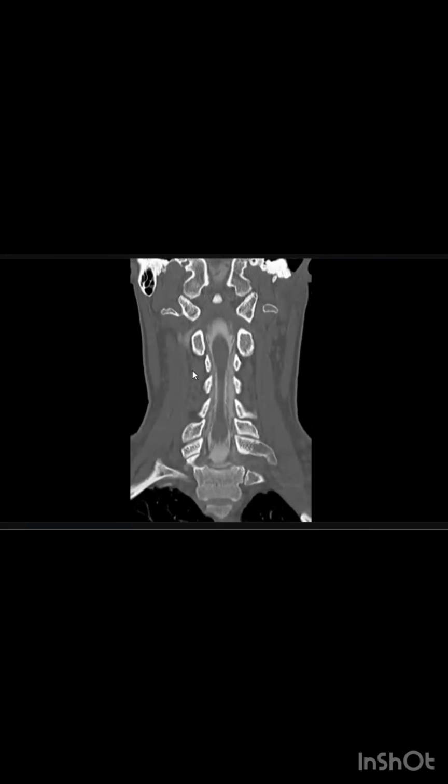They inject, I think, a blood patch inside the canal. For this case they also did an isotope scan and detected the contrast leak here. So this was the cause, and for management you put a non-targeted epidural patch, and also conservative management for the patient's symptoms.